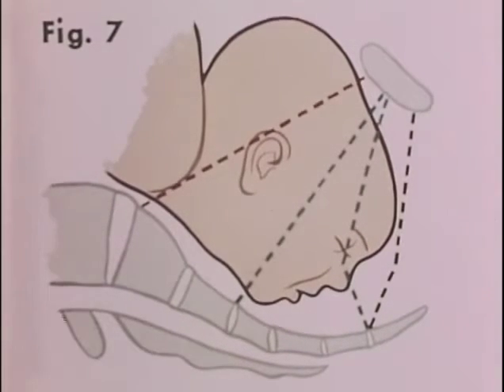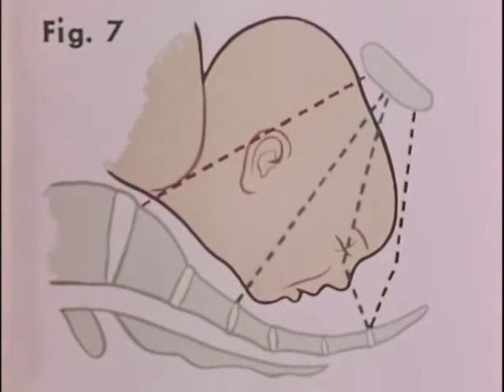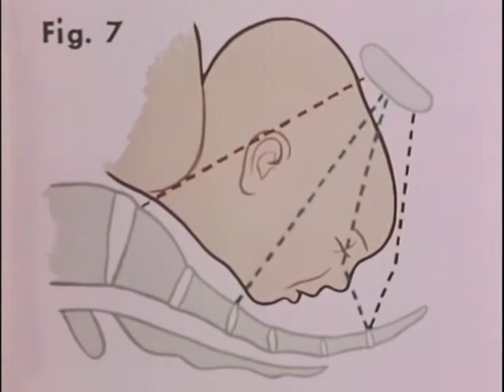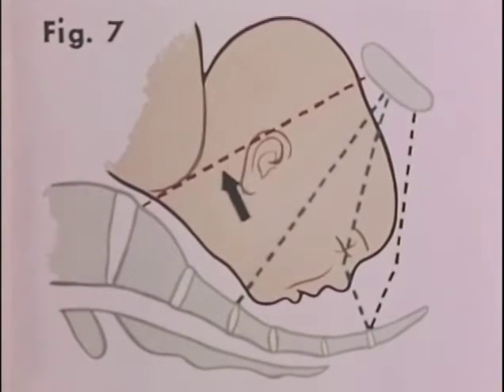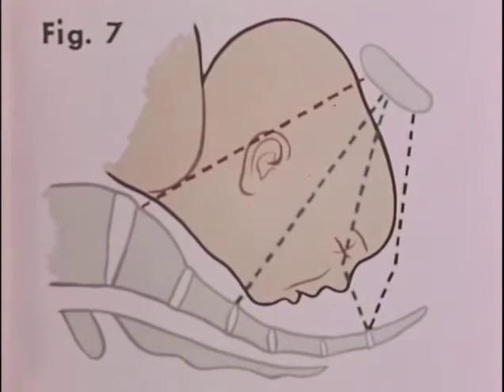The next exception represents extension to the degree of face presentation. Here, the leading bony point is down nearly to the black line, or the plane of the outlet. However, the biparietal diameter corresponds to the red line, which is the plane of the inlet. Therefore, this head should be classed as one which would lead to a high forceps.